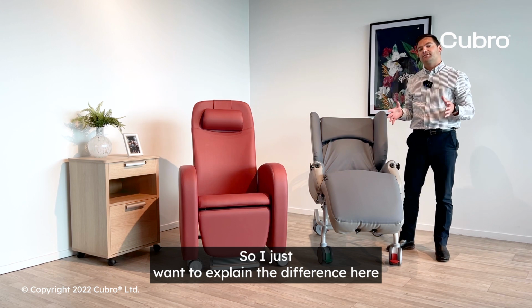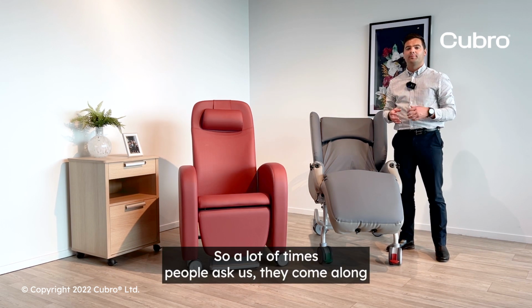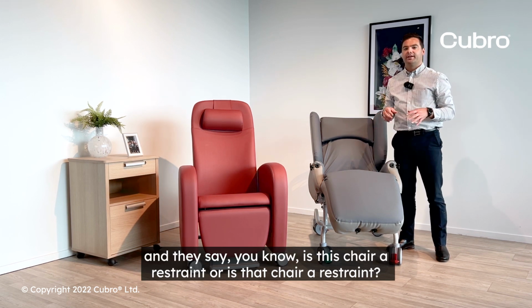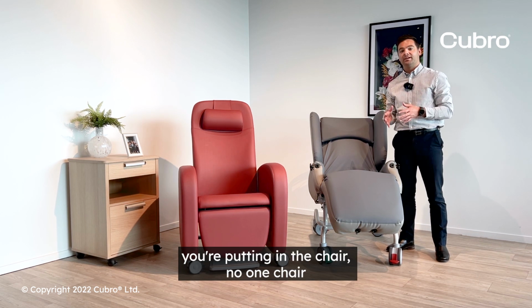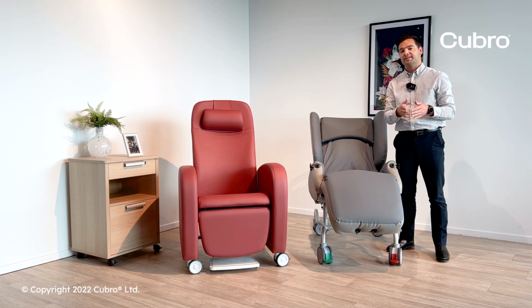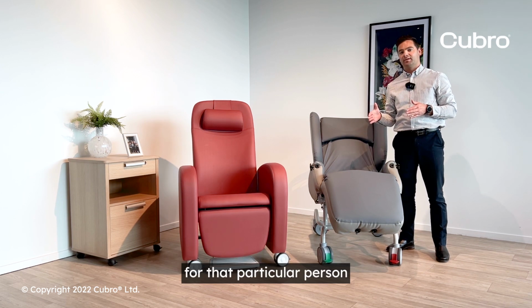So I just want to explain the difference here between a couple of chairs that we have in our seating range. A lot of times people come along and ask us, is this chair a restraint or is that chair a restraint? And I just want to emphasise the point, it's back to person-centred care. It's dependent on the person you're putting in the chair. No one chair suits everyone. You have to do an assessment of the resident to identify whether that is a restraint or isn't a restraint for that particular person.